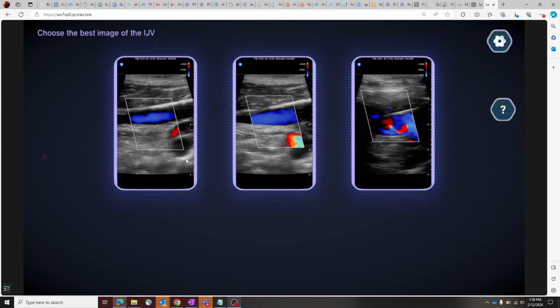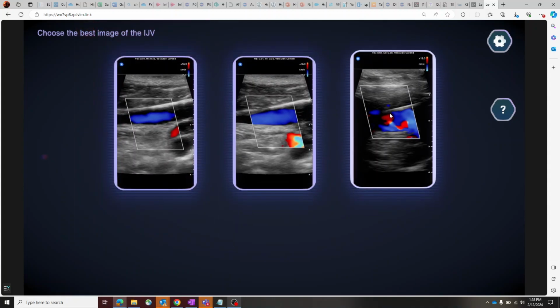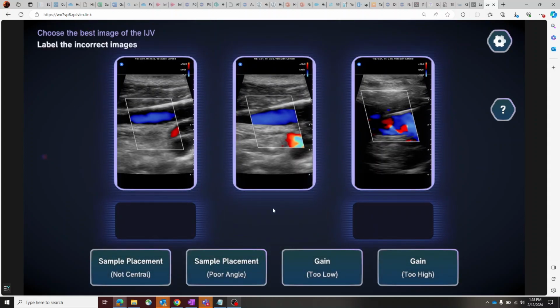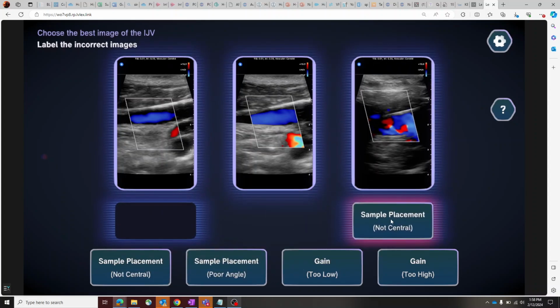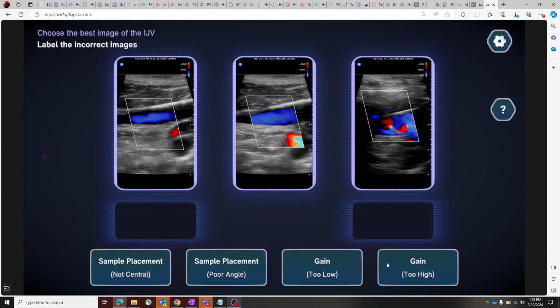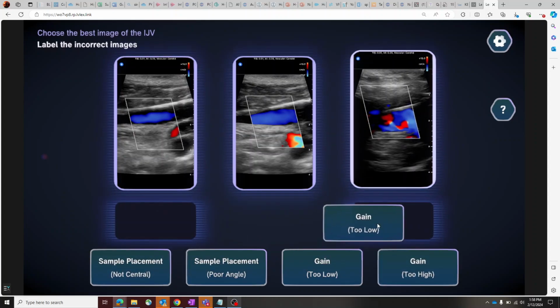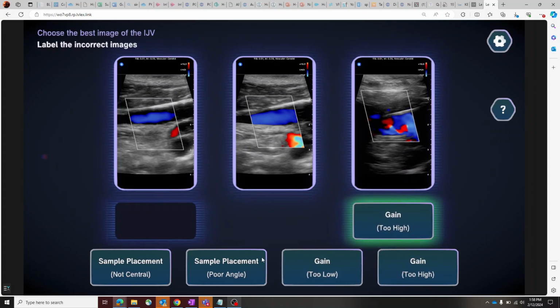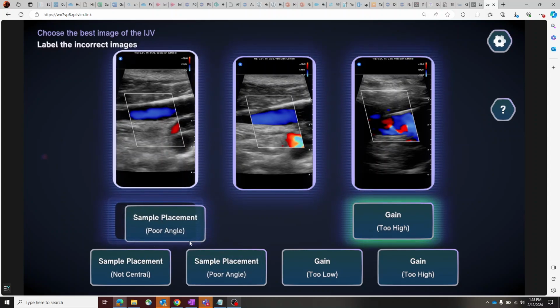This is getting into a little bit more additional applications here for other types of ultrasound training. So we're able to fully alter the field of view of the ultrasound beam. In the scanning simulation, you saw it was representing a linear probe, but if you'd like to do, for example, echocardiography, you could change it to have a curvilinear representation and a further depth of view. We could adjust the bounds of our field of view in any way to represent different ultrasound probes.